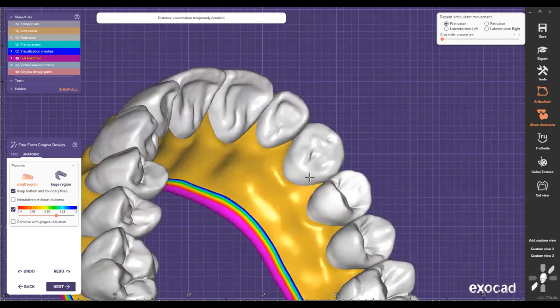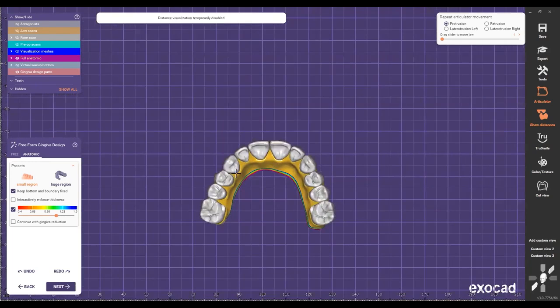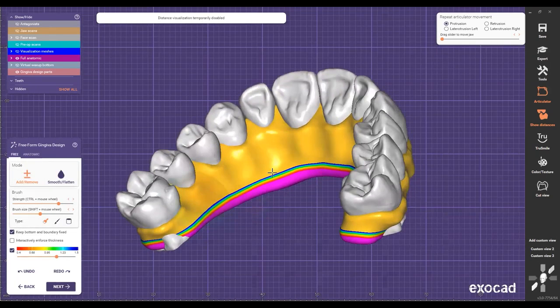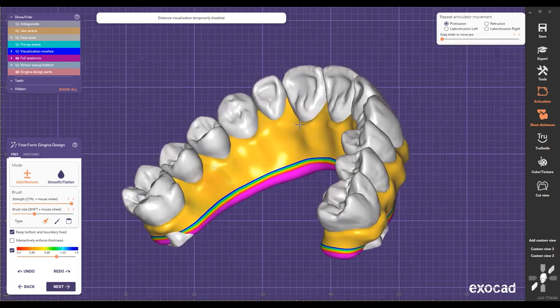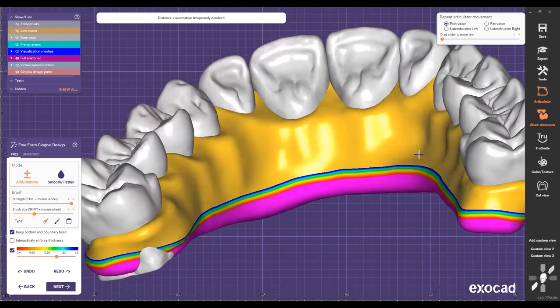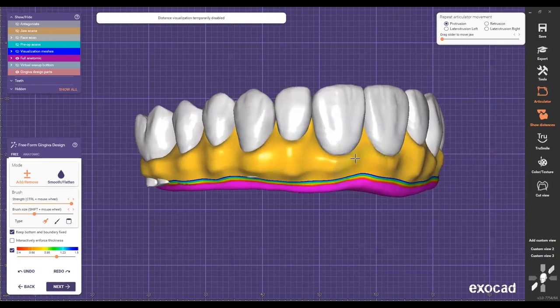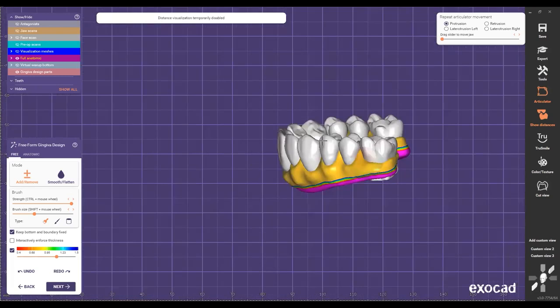Imagine, if you haven't seen videos of how technicians do this type of case with wax, right? They add a bunch of wax on there. They do that nice setup. They start melting a lot of wax on top, and they start peeling off the wax and all those things. So that's kind of what I like to do here. I start filling these holes, these concave areas, start making it more round, fill those areas, right? And I built a lot of wax right there.